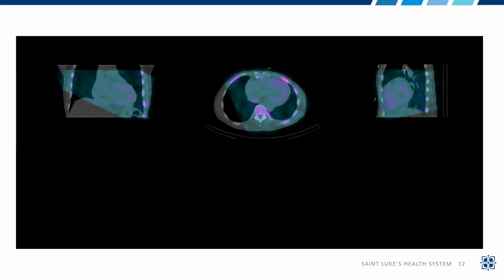This is what came off the camera here for his SPECT study, and on first blush you don't really see anything here. You see very faint, in this color scheme purple, but you can make out a slight view of the heart, certainly on the left image and the middle image and even the right image.